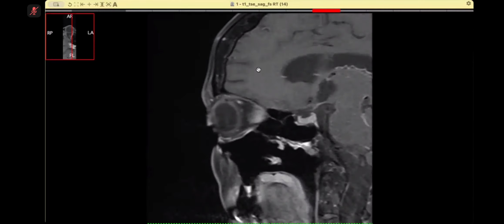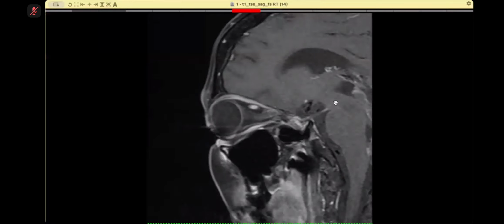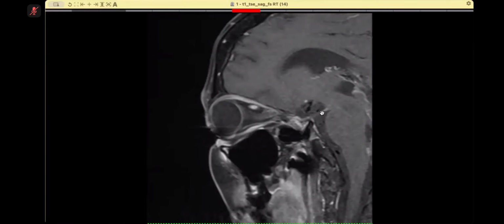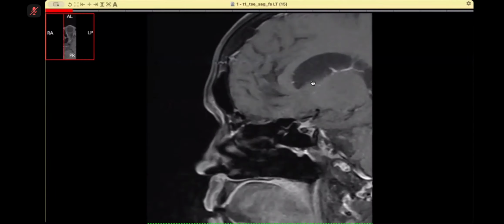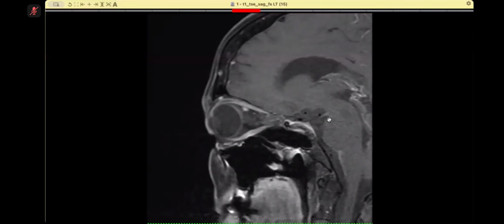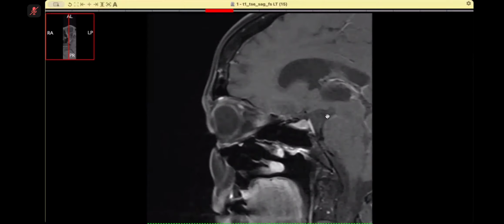Now, here, if you see, this is the midbrain. Do you see this is pons? From the midbrain, which nerve comes anteriorly? This is oculomotor. Please remember the trochlear also comes and it goes around the midbrain and comes anteriorly. So this is showing enhancement. And of course, because of time factor, I did not show you. And on the other hand, you can see that the other sided nerve is also showing enhancement just at the root entry zone where it is touching the midbrain.